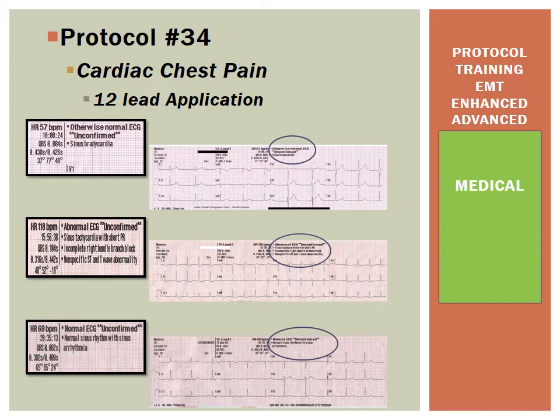This patient, it says they have sinus tachycardia. They might possibly have a certain type of blockage, and it's an electrical blockage, not a mechanical blockage, but a right bundle branch block. The bottom one says normal ECG unconfirmed, and you will see this very frequently.